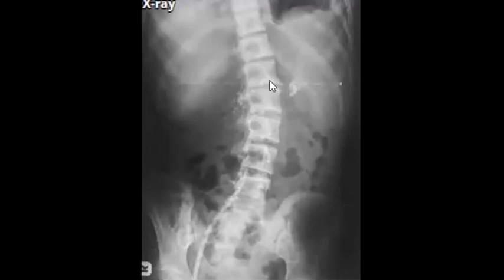Calcification along the side of the pancreas. So it will be chronic pancreatitis. Yes, chronic pancreatitis. Very difficult, I know, but they like it in the exam. Maybe now it is more obvious, okay.